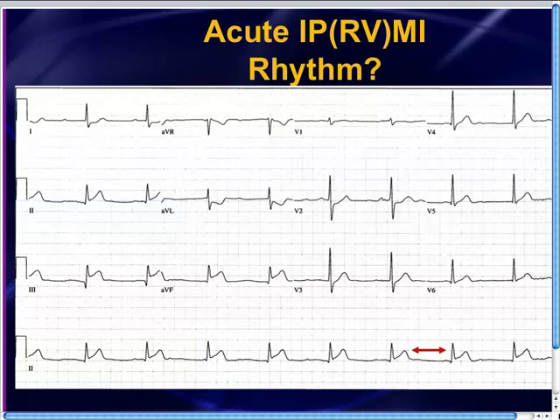Now you don't see atrial beats in all of these leads well, but you know it's upright in 1 and 2 and upright in AVL and inverted in AVR. So let's just give it the benefit of the doubt and say that this is probably sinus node activity. So the first part of the interpretation of the rhythm is this is sinus rhythm with a sinus rate going in the 90s.